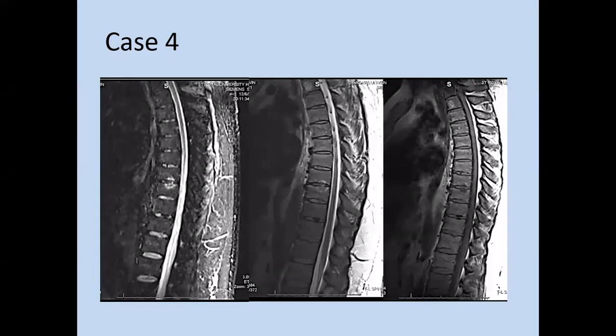The intensity of the intervertebral disc may become more high signal on T2. Semilunar shape. Okay, so the major imaging feature that would help you differentiate between Andersson lesion and discitis is the disc height. Normally with discitis, what do we expect to see? Obliteration, decrease in the disc height.